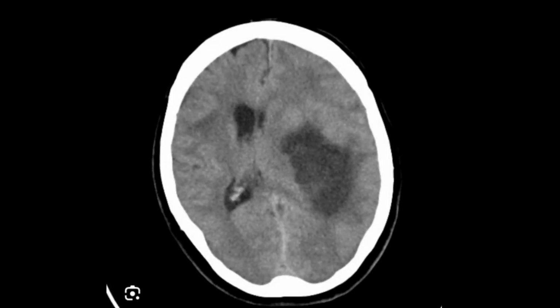Again, another example of anaplastic astrocytoma, which is grade 3 according to the WHO classification. It happens to be hypodense with extensive infiltration, and with peritumoral vasogenic edema causing compression onto the lateral ventricle and causing midline shift. Particularly in this case, it is resulting in contralateral hydrocephalus and prominence of the anterior and posterior horn of the lateral ventricle. This is anaplastic astrocytoma grade 3 of the WHO classification.